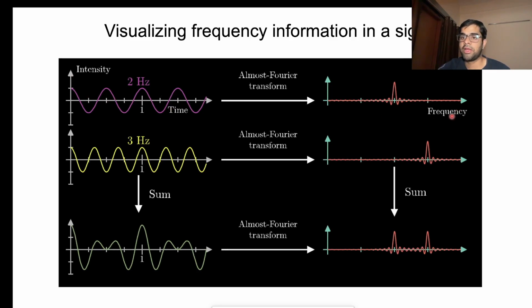It's frequency, what kind of oscillation is present in a given signal. Based on what Atharva told, it's the fundamental difference in this axis itself. You should not compare why this is like this but not this one. These two are information in the same signal, two different attributes of the same signal. One is frequency, one is time.